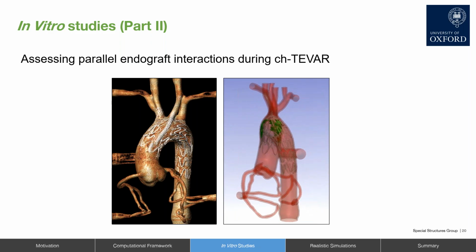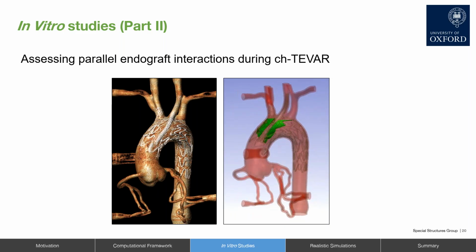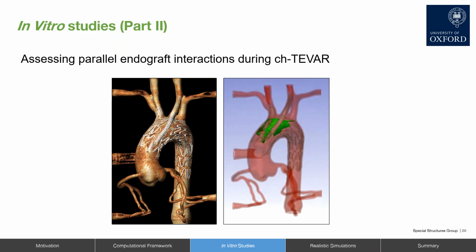And specifically, what we can look at is segmenting things like the silicon arterial wall, the main graft, the chimney grafts. And using a workflow developed for this particular study, we can identify and characterize gutter formation within the dynamic model, which is what we're seeing here in green.